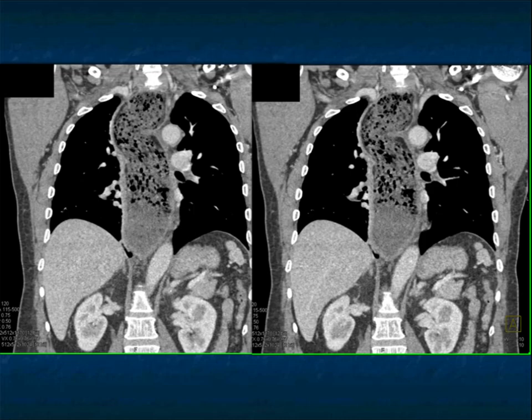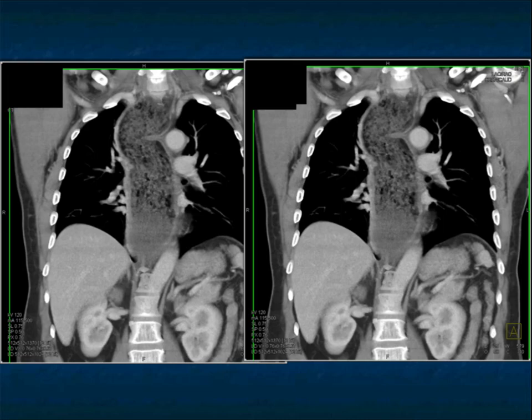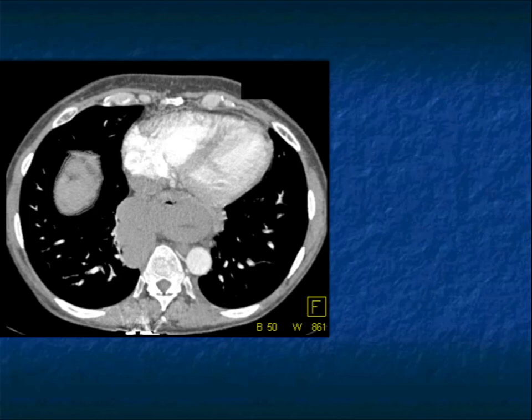It's amazing how often these patients present late. Patients will get endoscopy. They'll be looking for the possibility of fistula, looking for the possibility of tumors. There's an increased incidence of esophageal cancer as well as tracheal and lung cancer in these patients. And they'll also do a scoping and try to dilate the region near the GE junction and lower esophagus. Just a beautiful example of achalasia, and classically presents as a widened mediastinum. On CT, the answer is typically very obvious.